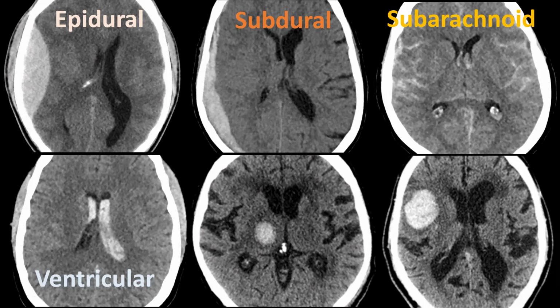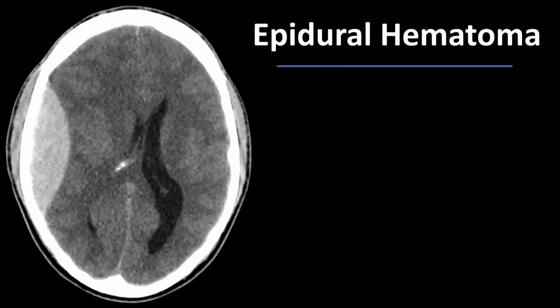And when it comes to the deep hemorrhages located inside the brain parenchyma, you can also make a distinction which will have implications for the differential diagnosis between a parenchymal hematoma located in deep structures and a parenchymal hematoma located superficially in the brain, a so-called lobar intraparenchymal hematoma. Let's examine these various hematomas or hemorrhages one at a time. Let's start with an epidural hematoma.